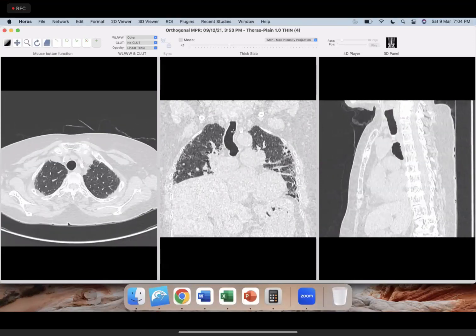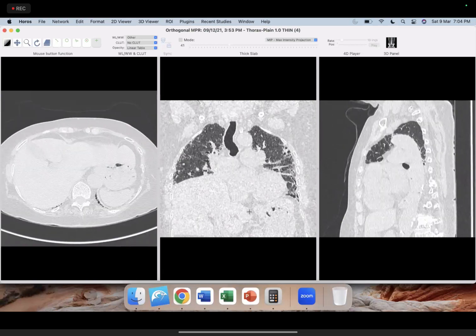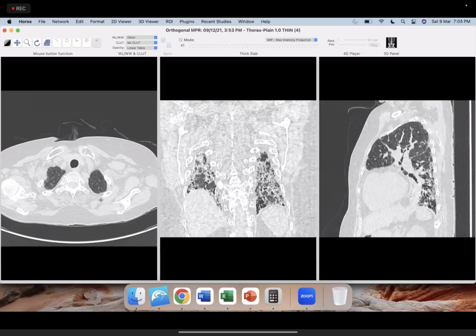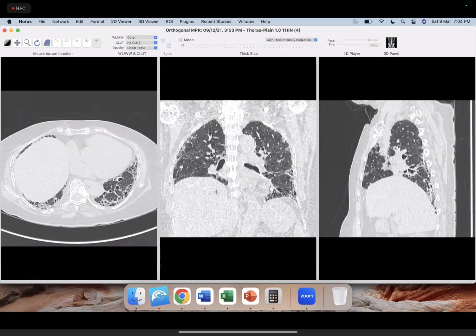Volume data set. Now, running through, scrolling down from craniocaudal direction, try to pick all the signs that you need for your interpretation and diagnosis. Now I'll just show the coronal ones to be able to judge the gradient and other stuff, and also sagittal ones. Now if I have to just stop at the representative images, this would be it.